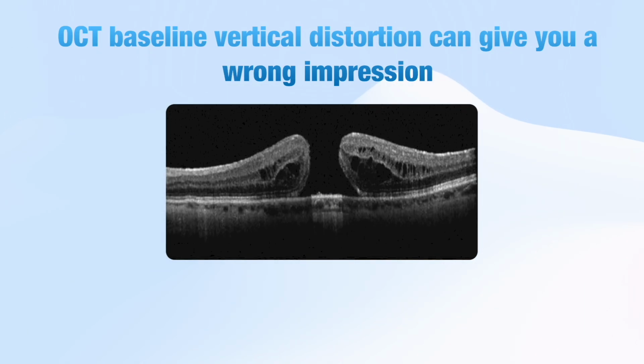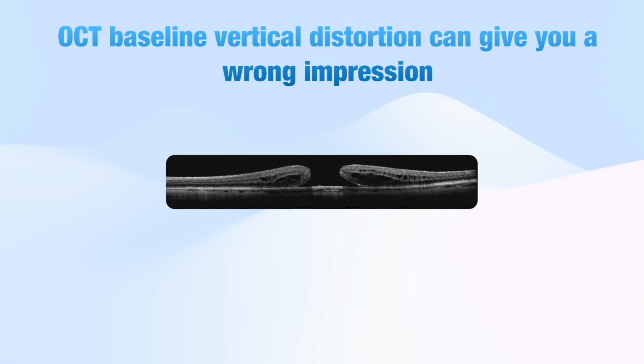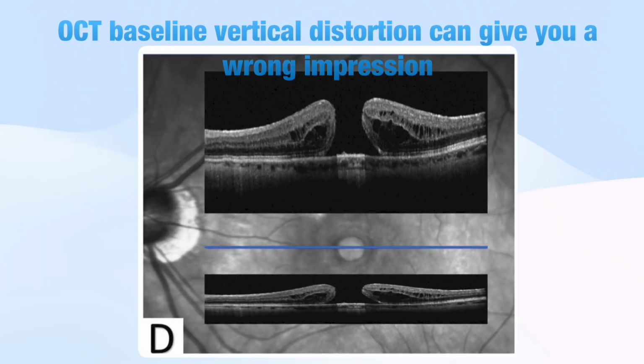For instance, this macular hole looks like an easy-to-close drawbridge, while it actually is much flatter. Such y-axis elongation in presented images leaves a distorted impression of how easily the hole may close with surgery.